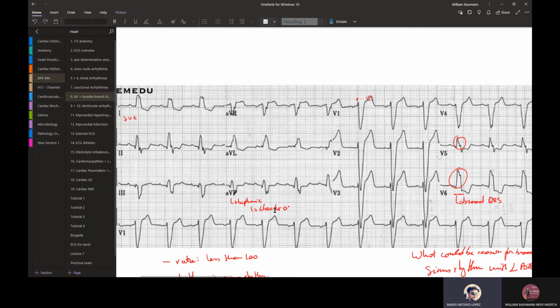Okay, so then that's at 0 degrees. Because one is positive and AVF is about the same, it means that it's going to be close to 0. Okay, so would that put you at the first quadrant? That means it's not very negative, meaning it's not going to be in the left. Sorry, it's not going to be in the first quadrant. It's more likely to be on the right side around 0, which is okay. It's not bad.